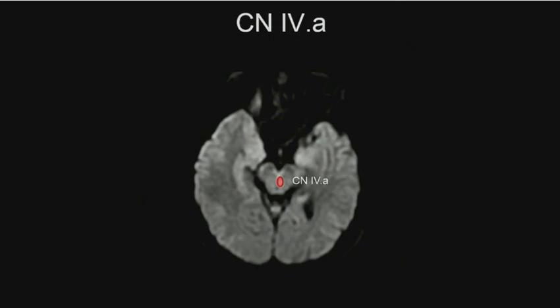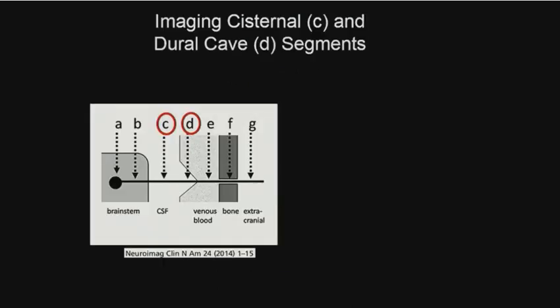And so this is the location of the fourth nerve nucleus on the left. This patient had a stroke of their left fourth nerve nucleus, recalling that the parenchymal fascicular segments decussate for the fourth nerve before leaving the brainstem, and it is the only cranial nerve to exit the dorsal aspect of the brainstem.